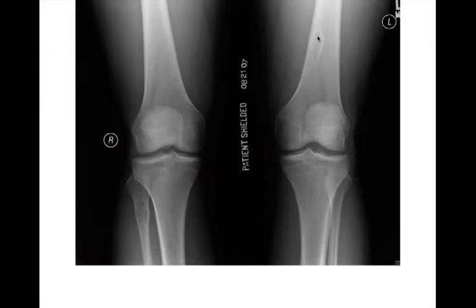So, assuming they're in the right age, if this patient were 80, I'd maybe think about it a little longer. There's another one right here. So this was a patient with Jaffe-Campanacci and multiple non-ossifying fibromas.